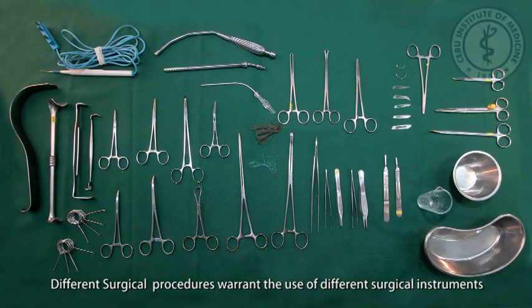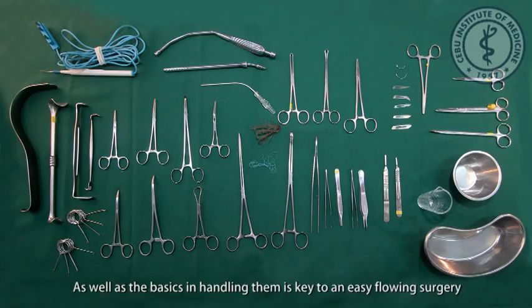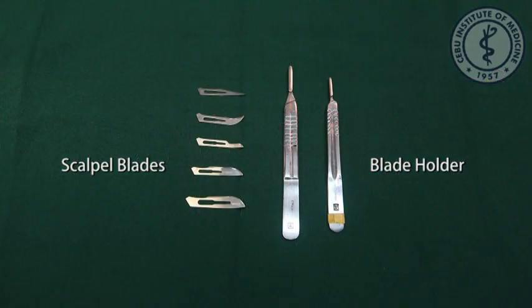Basic surgical instruments. Different surgical procedures warrant the use of different surgical instruments. Knowing each instrument and its functions, as well as the basics in handling them, is the key to an easy-flowing surgery. Scalpel blades. Blade holder.